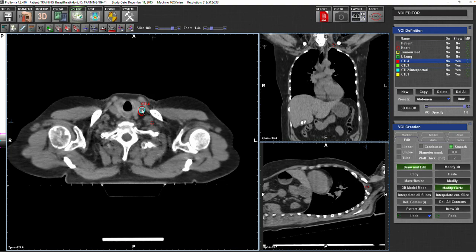In the head and neck, you go just posterior to the sternomastoid muscle, but in breast, we don't usually do that. We are just concerned by the subclavian and the internal jugular vein. And then there will be a muscle, and just posterior to the muscle, this will be the artery I'm looking for. So all you need to do is to take the muscles as well as the artery and cover it properly, and you just end up with something like that.